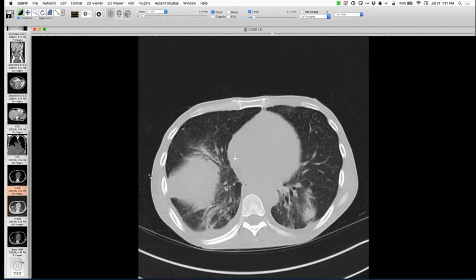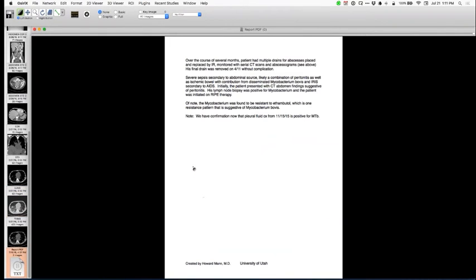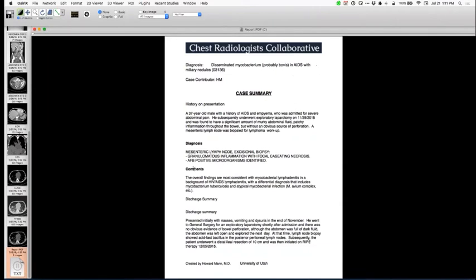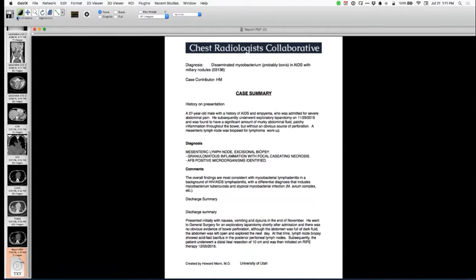So Howard, it was TB or was it bovis? Well, I don't know if they ever made that distinction. Someone suggested based on this that it might be, but I couldn't find any place where they had cultured and actually characterized it as bovis. And I don't know if that's easy to do and separate it out from MTB in the usual way. But they said there was MTB, correct? Oh yeah, here's a mesenteric lymph node with MTB, and you got it from the pleural fluid as well. Okay. Right here. Pleural fluid culture from November of last year, positive for MTB. Yeah. Okay. Thank you. Yeah, sure.